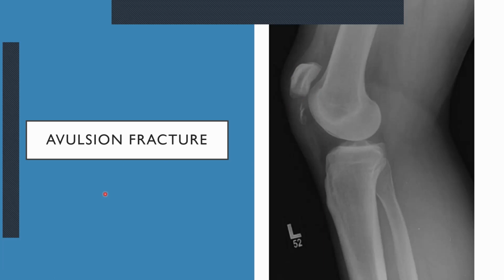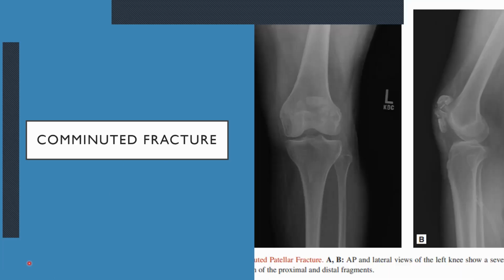And it's the body's own reaction. It does not allow any weight bearing at all once that patella is out of commission. So it's one of those things that you've really got to look at and see what's going on. So if we have a look here, we can see a comminuted fracture of the patella. It's quite easy to see. If you have a look there, you can see this patella has been torn to shreds. There's really nothing that's left over there. Now, this is normally with direct force that would come on and affect the patella like that.